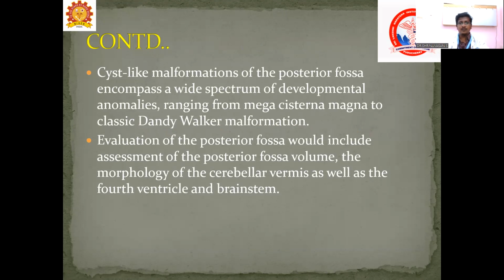like Dandy-Walker malformation. The evaluation of the posterior fossa includes assessment of the posterior fossa volume, the morphology of the cerebellar vermis, as well as the fourth ventricle and brainstem.